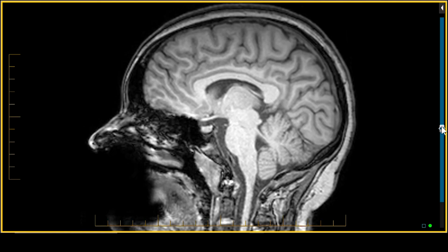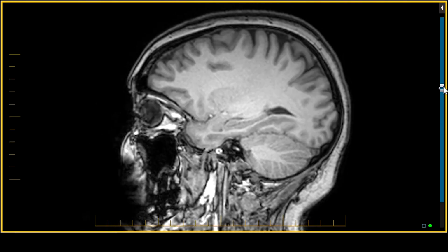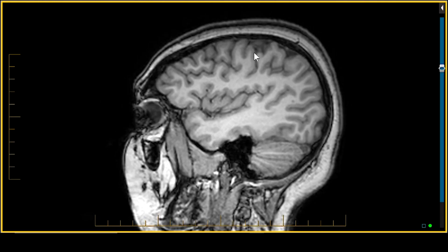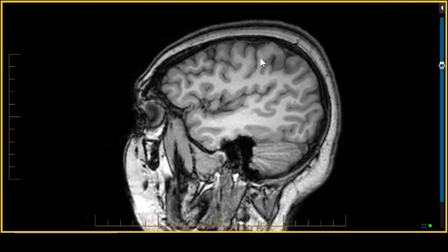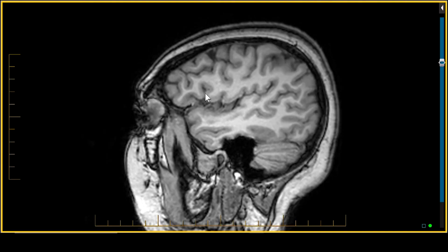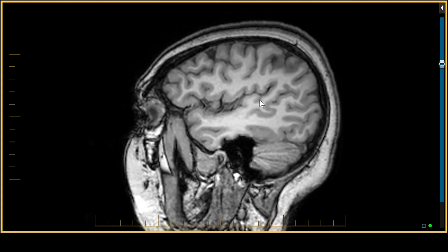Now, as we scroll off to the side, we suddenly and without warning lose our central sulcus of Rolando. We're going to get it back in a second, and it has come back right here. So here's the central sulcus of Rolando. In front of it is the precentral gyrus, which is bigger. The postcentral gyrus is smaller. And let's go to our Sylvian fissure for a minute. Our Sylvian fissure, shaped like a caterpillar. Here's the anterior horizontal ramus, anterior ascending ramus, posterior ascending ramus, and maybe a small posterior descending ramus.